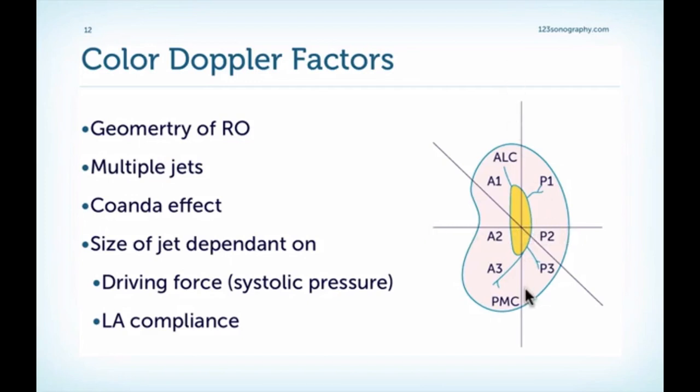Usually, especially if we have secondary forms of regurgitation as in annular dilatation, the shape will be like this, more oval, along the line of closure. So we will always overestimate the severity of regurgitation in a two-chamber view where we cut along the commissure line.